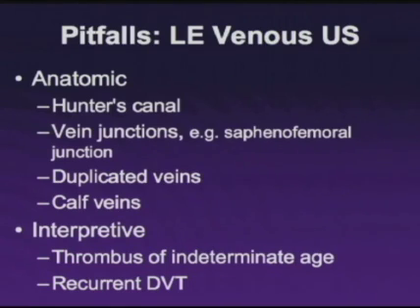One issue, though, is recurrent DVT. Recurrent DVT is acute deep venous thrombosis on top of chronic change, and this can be a quite difficult study to diagnose. There are some clues, however. One is that an old study is available and there is a new thrombus in a location that was free of thrombus previously. The other may be that there was a small vein or small residual scarring previously, and now this has gotten larger. In fact, some people measure the size of the residual vein, and differences of 2 millimeters have been described as being significant.